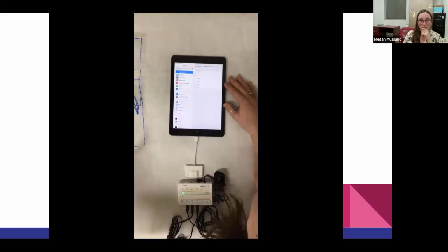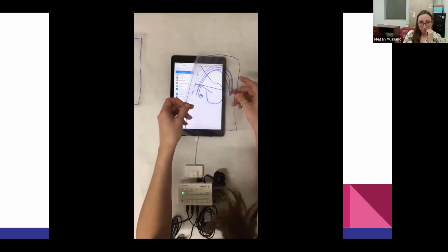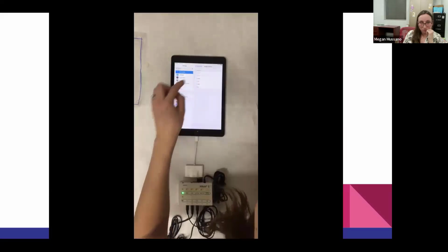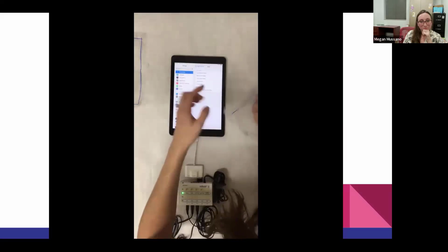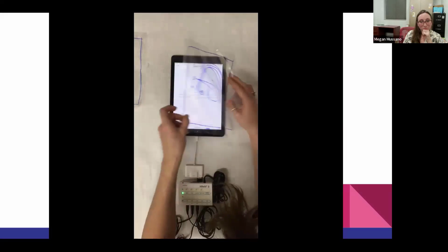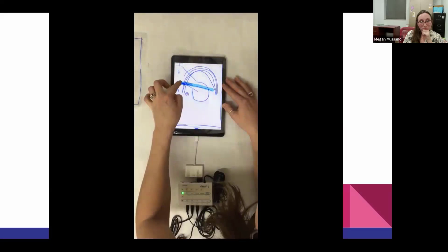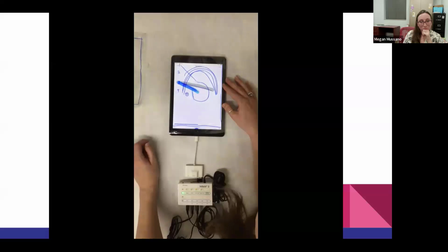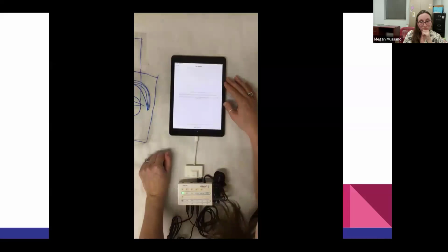And I'm going to do another one. Number 3, I can't remember what that was. Oh, it's putting cucumbers on the eyes, so I'm going to do the orange up arrow because that's the next one. I'm going to create another custom gesture. And I'm going to go grab 1 cucumber and grab another cucumber. And those will be the 2 cucumbers on her eyes. And I'm going to save that.